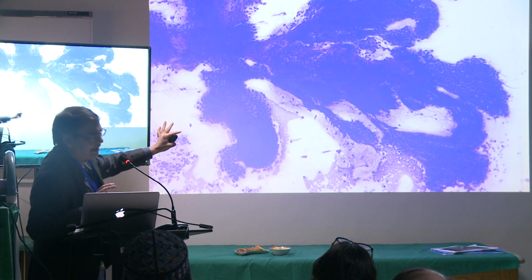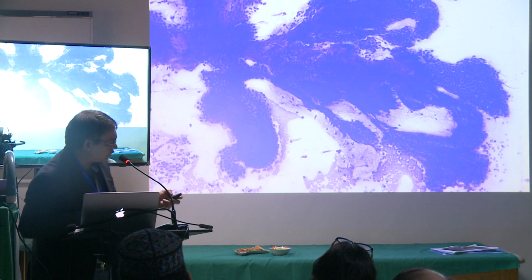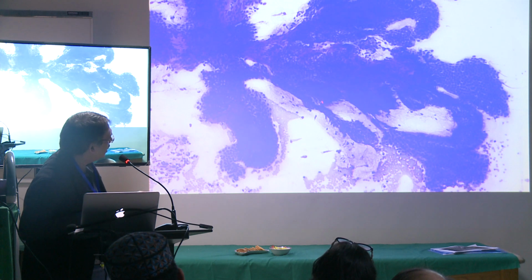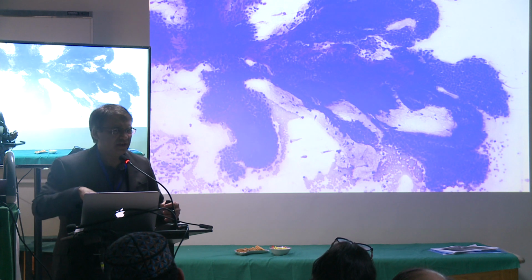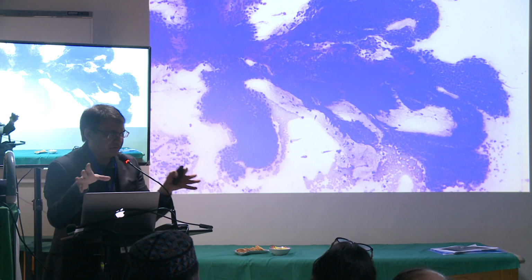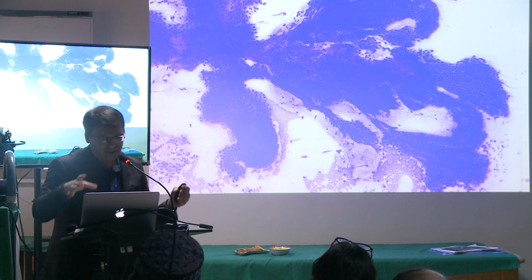So you really can't call this a cancer or even some major dysplasia, but you do see some fibrous tissue, and if you see some inflammatory cells, I can't see that much, but when you see fibrous tissue, inflammatory cells, in a specimen from the pancreas with otherwise normal cells, you start thinking about a chronic pancreatitis, okay?